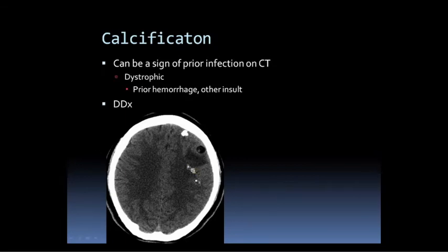But we also have some local calcifications. We have a calcification here, we have a calcification here, and this is actually kind of a target sign. So when you have the central dot here and the surrounding halo around it, this is a classic finding of cysticercosis. And the fact that we have other calcifications here tells us that this is most likely cysticercosis in some different stages here. This is kind of an old healed stage, when you see calcification there.